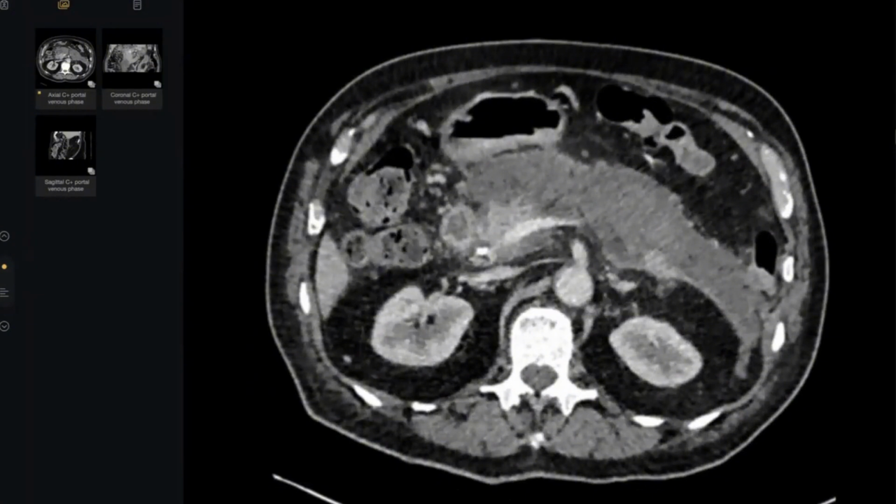So, what's your opinion? An obstructive biliary stone causing necrotizing pancreatitis. This is an emergency. I would like to urgently convey the findings to the referring physician for urgent ERCP removal of the stone, and correlate with the pancreatic enzymes. The patient needs urgent management and follow-up. Maybe IR drainage of this collection, and removal of the gallstone in the future.